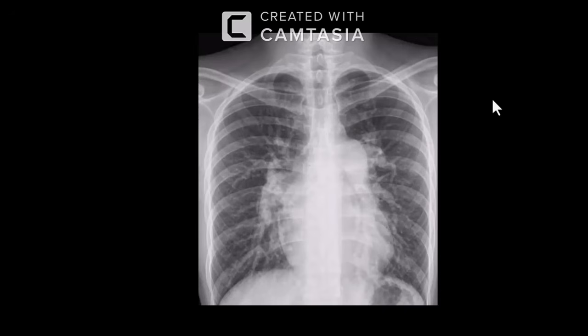To summarize, this is a case of bilateral pulmonary artery enlargement, possibly pulmonary arterial hypertension. I would raise the possibility and advise referral for CT pulmonary angiogram as well as a pulmonology referral. If this patient is young, this can be primary pulmonary hypertension without any cause. However, associated causes need to be ruled out. Yes, thank you.